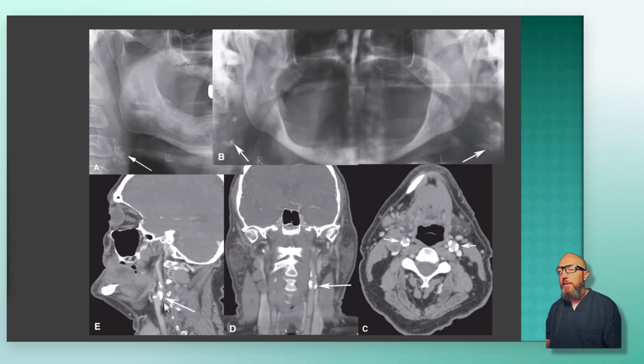And then, of course, if you have the 3D view, here's a medical CT showing these calcifications, outlining right where you would expect the carotid calcification, and then following up the external carotid here as well. Here we have a bilateral, fairly thick, dense calcifications.